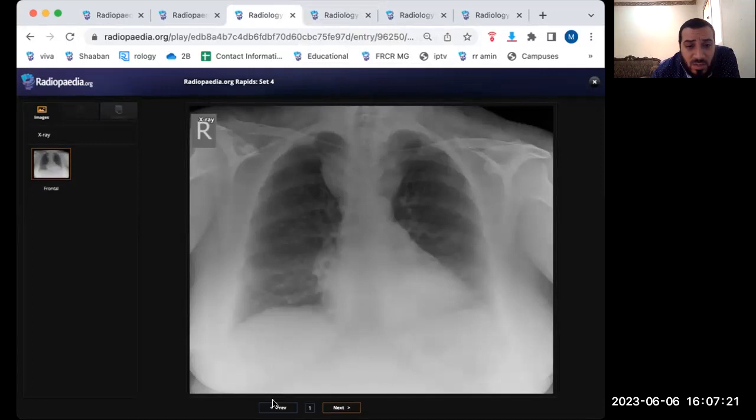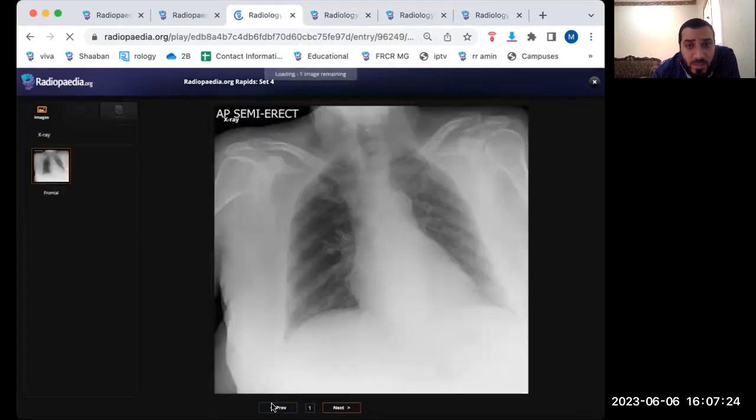The previous one, why did you mention dislocation? Why dislocated? What are the signs? As I told you, we are searching for the signs, and we have a clear abnormality. So ignore anything else. Light bulb only is not a clear sign for posterior shoulder dislocation. It should have at least 2 or 3 signs for posterior shoulder dislocation. Light bulb only could happen on the internal rotation view of the shoulder. And you have a clear abnormality. Ignore anything else.